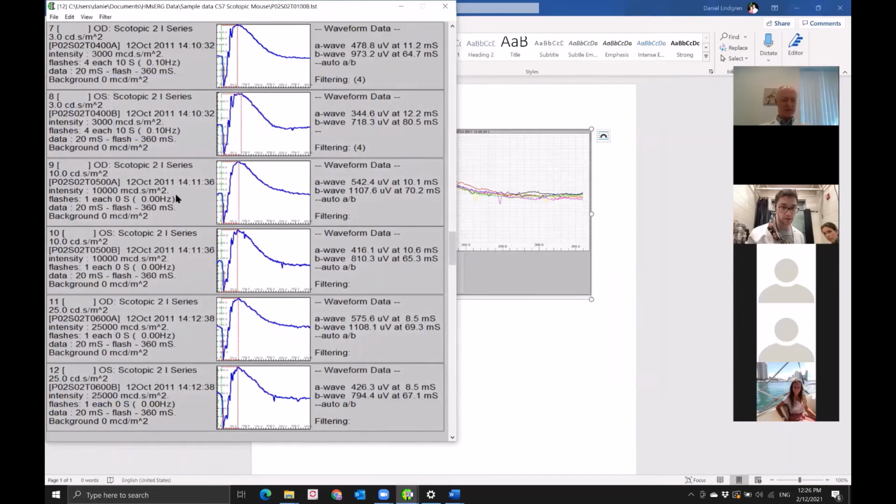Those are really the key components on the reporting side. Let me do one more. I'm going to read a question here and see how I can answer it.